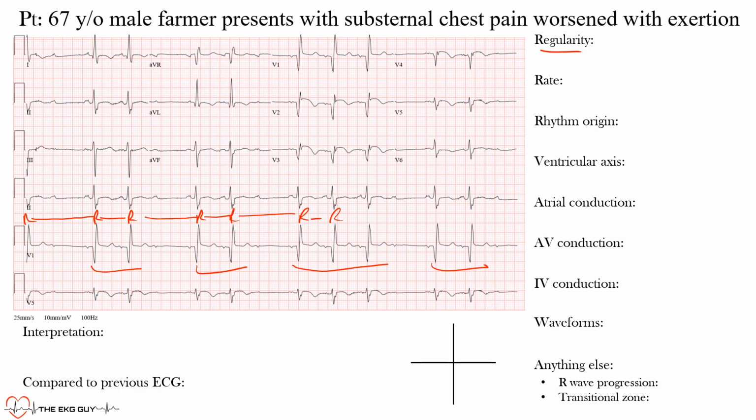So not so much regularity to it, so we would still call this an irregular rhythm in terms of the R waves or QRS complexes, okay? But there are some other waves that are occurring more regularly, and those are the P waves, okay? And the P waves are these here. Here's a P wave, here's another one, okay? A P wave here, here, here. And if you were to measure these out, these would be all P waves, okay?